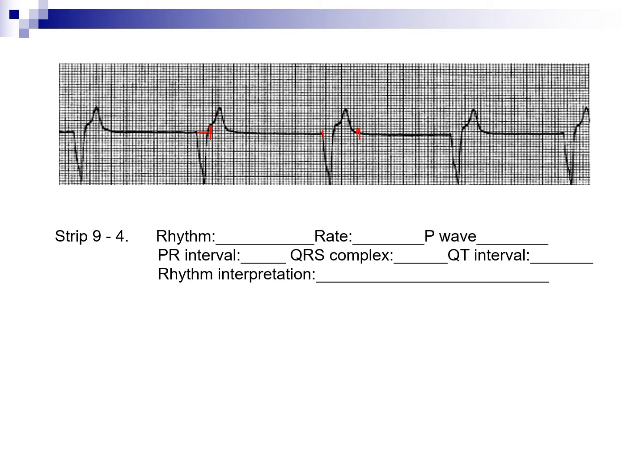One of the most important things to remember is that some people will confuse IVR with junctional, and know that the difference between junctional and IVR is the QRS. Where does the junction come from? The atrium. So the bottom of the atrium, but the junctional rhythm has a normal QRS. It is regular and it has a normal QRS. The IVR, the R to R is most generally regular, but the QRS is wide because it's coming from the ventricles.